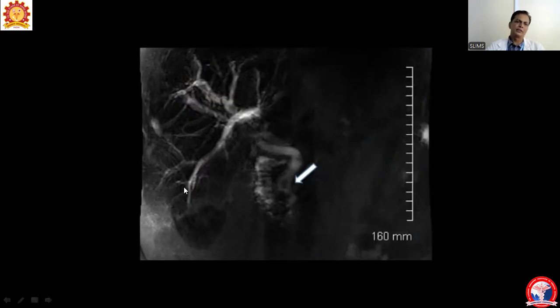This is parallel to ERCP, but relatively completely non-invasive. This is an investigation done on MRI. It's called MRCP, magnetic resonance cholangiopancreatography. So here, what we are seeing is a dilated CBD and the duodenum. In the distal region of the CBD there are two calculi actually. There is one obstructing calculus here, which is signal void, darker, and here again an intraluminal non-obstructing calculus, which is relatively floating.